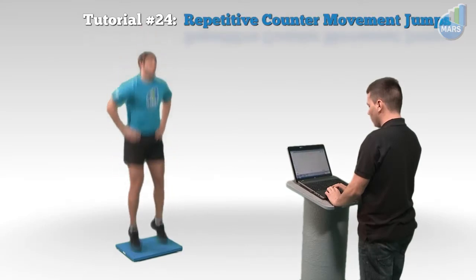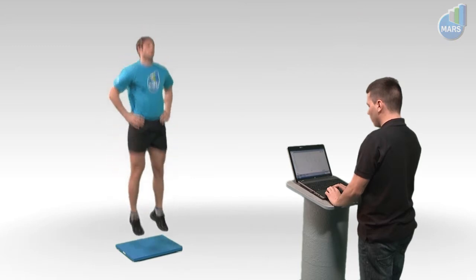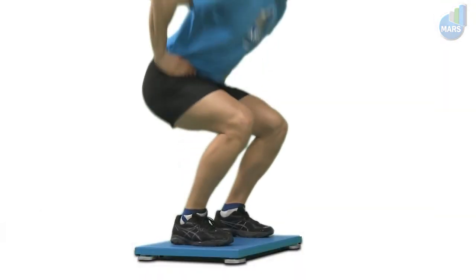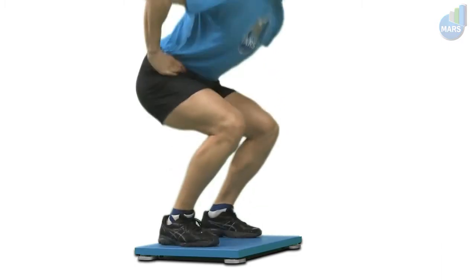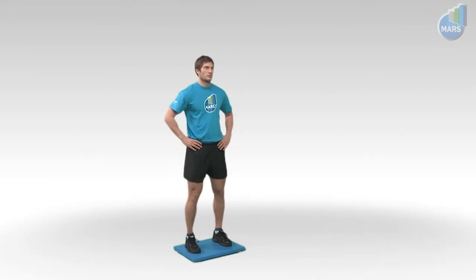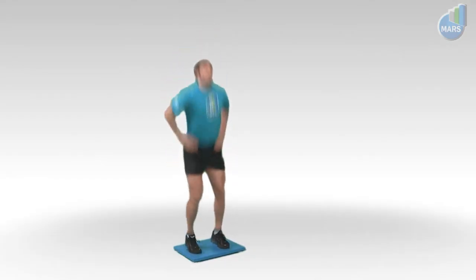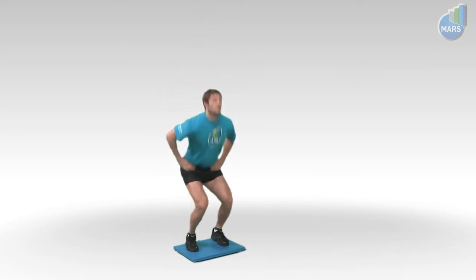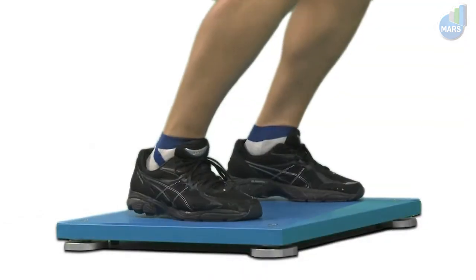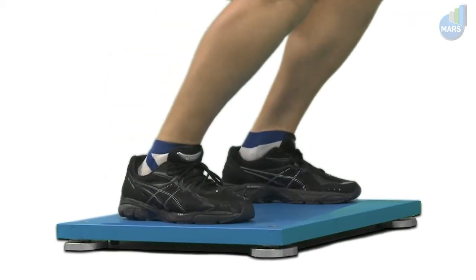Repetitive counter-movement jumping is a repetitive vertical jump whereby an eccentric-concentric muscle action of the lower extremities and trunk are used in a continuous manner. Based on the parameters changed through the repetitions, we can analyze some basic biomechanical and functional characteristics of the neuromuscular system, specifically those related to the neuromuscular fatigue developing during sustained explosive power actions.